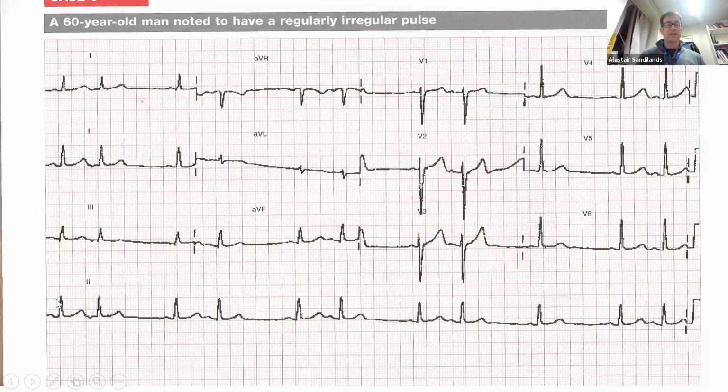So what we have is this is the normal beat, and this is the atrial ectopic. And after an atrial ectopic, we have a compensatory pause. The heart pauses to reset itself. Sinus node fires again. And we've got a different focal discrete P wave here. Again, resets itself. So we have a period here of atrial bigeminy.